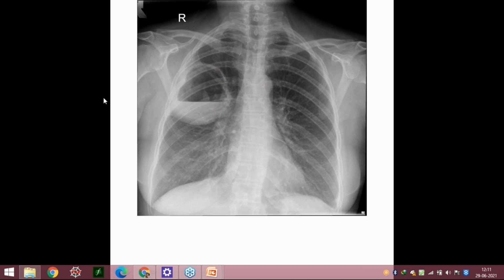The cavity has fluid at the bottom, but air on top, so in abscess... See, that is what the thing is, that in a lung abscess, sometimes if it has a connection with the bronchus, it will have an air fluid level. There may be a lung abscess where it is just completely... okay. So Sparsh, what the issue is that, see, whenever there is an abscess, it cannot be a complete opacification, because lung abscess is defined as when there is destruction of... okay, so if we go into further details, when I talked about the previous X-ray, which was an upper lobe consolidation, in upper lobe consolidation, what we are finding is that the architecture of the lung is still maintained. Your alveoli are intact, your respiratory tract is intact, but there is fluid in the alveoli, there is exudation in the alveoli.